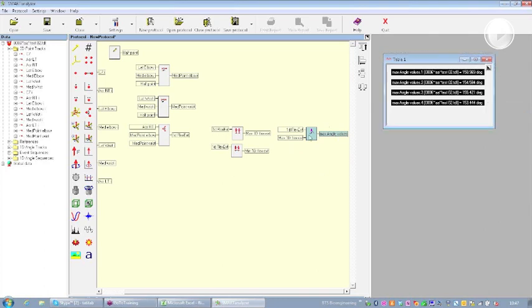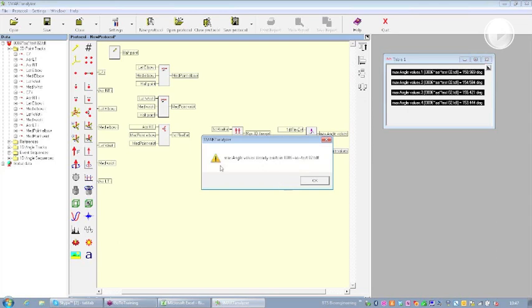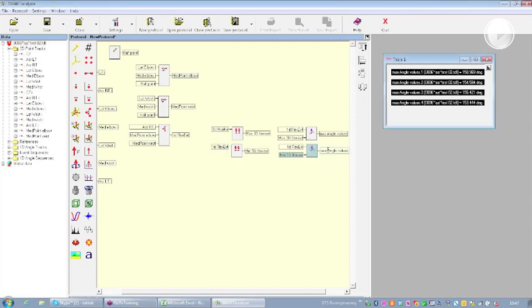same thing for the minimum. So I copy and paste, this time the same angle but different events. This message is always the same, telling me that I need to change the name, and I will have minimum angle values over here.